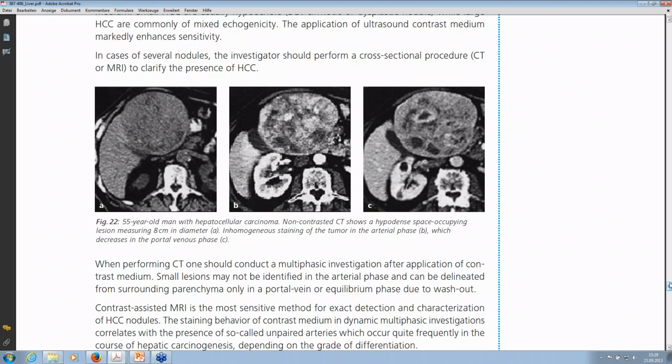And of course you need to also look at the patient history, what was present there. Just from this image you can suppose it's a malignant disease, and that's my comment.